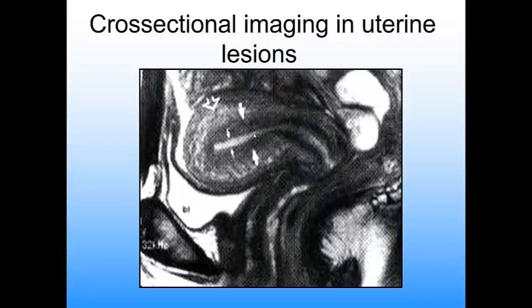And surrounding the endometrium, the thickness of the endometrium, as we used to see in ultrasound, whether it is proliferative, secretory phase or whatever, we can measure in the sagittal plane on MRI. And this is the normal signal, because sometimes the endometrial pathology is not only a thickened endometrium, we find altered signal of the endometrium. So this is the normal endometrium.